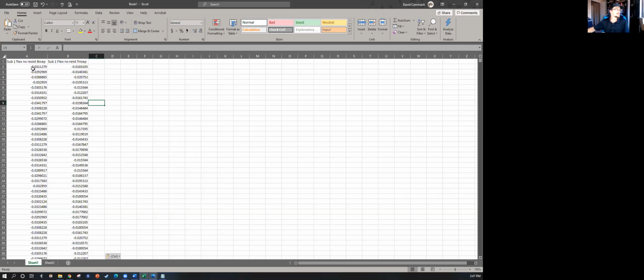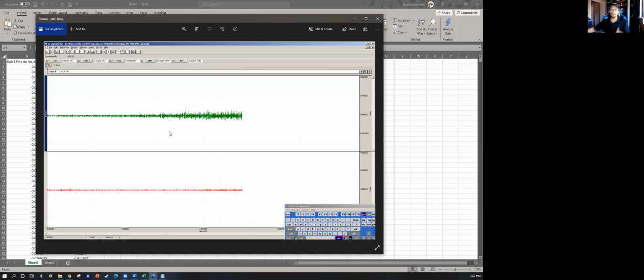First thing that we're going to do is take all this data and find the absolute value. One thing I'm going to pull over is what the data looks like when we're testing it. So we have up and down movements. One of the things that we ideally want to do is get the actual value of this, because theoretically if we average this it'll get pretty close to 0. We just want to see one direction of it.